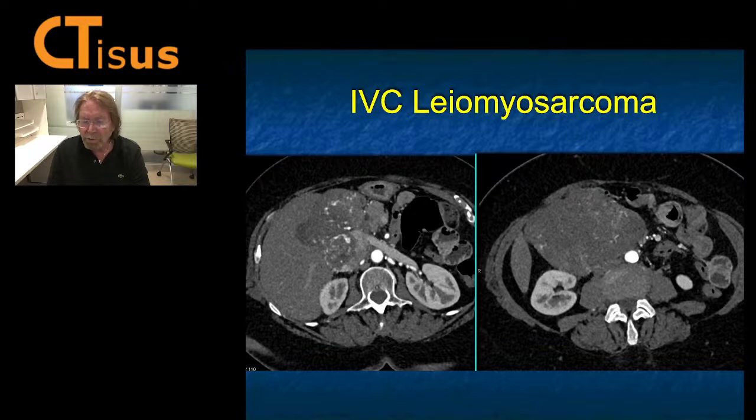The rare tumors, they can be large. You can see extension into the IVC by tumors. I mentioned adrenal, liver, and renal, also stromal sarcomas from the uterus. But primary tumors of the IVC, classically IVC sarcoma. What a great case.